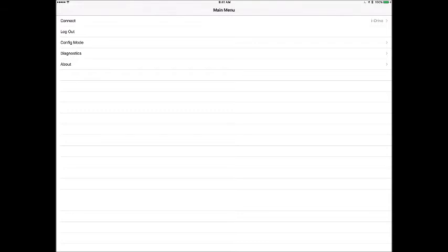So we do offer courses and classes to go over what products we offer and how they function and everything. So we're going to start off here under the configuration mode.